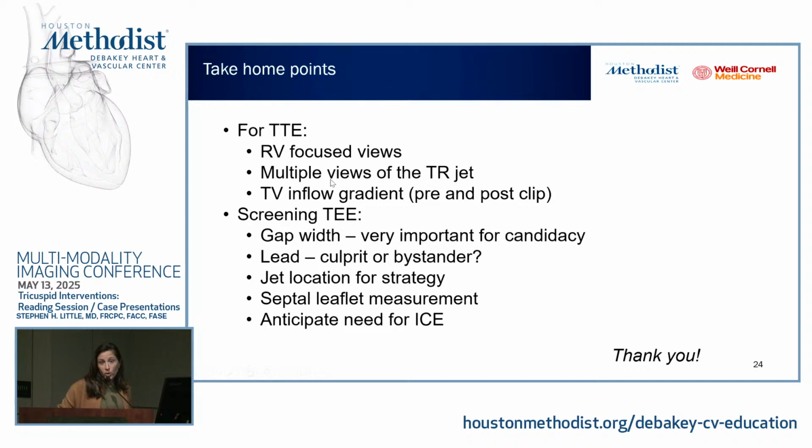So just a few take-home points before we answer questions, and Dr. Little is here to help with that as well. For TTE, it's very important to look at the jet in multiple views, and to look at the inflow gradient. So let's say one of the echo techs here is looking at the patient's TTE in the hospital after one of these procedures. Very important to look at the gradient, to assess the jet in multiple views, and to focus a lot on the RV and RV function, etc.